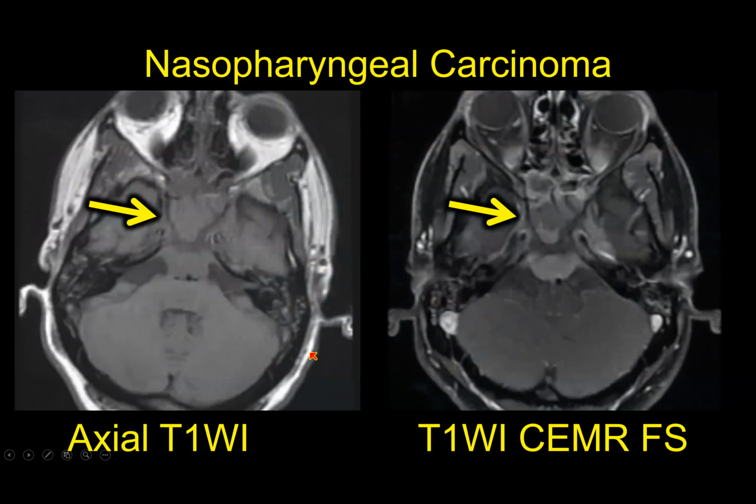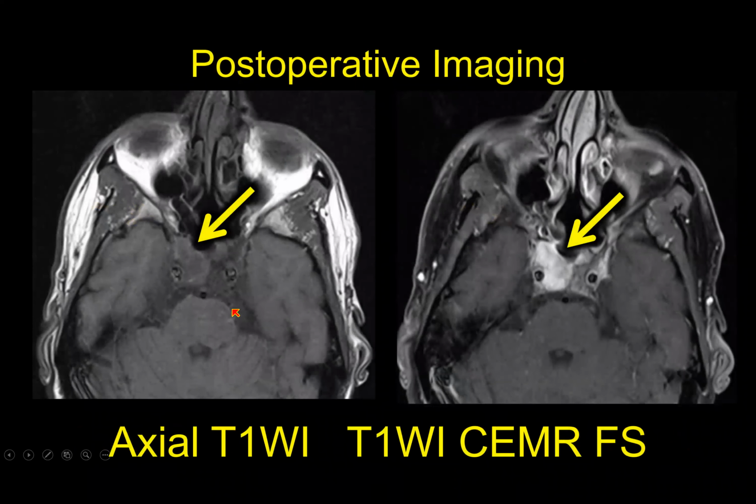As an example of that, this was a case that was read out. This patient had a nasopharyngeal carcinoma. You see it invading the skull base. Maybe it's in both cavernous sinuses. It's in the prepontine cistern back here. They did surgery, resected the lesion, and this is a follow-up. And this was read out as definitely disease, NI-RADS 4, because of this big enhancing lesion. And they said, well, the lesion was originally enhancing.